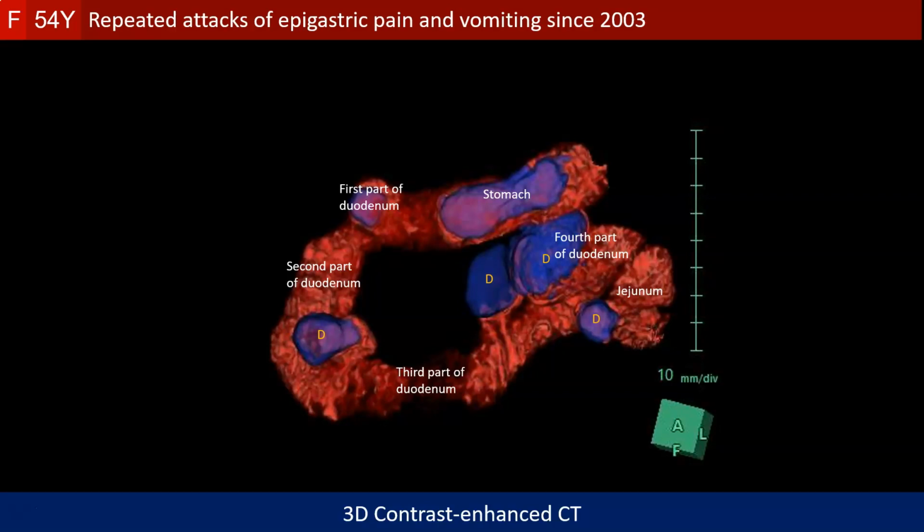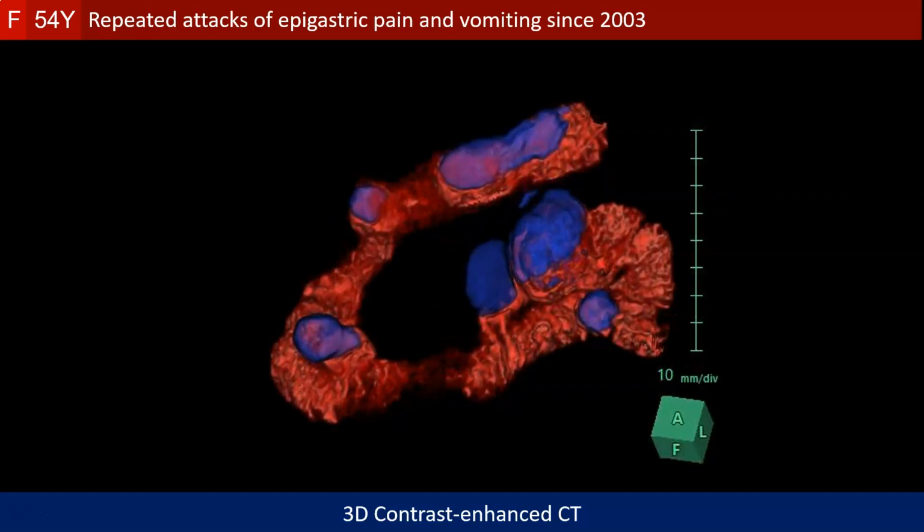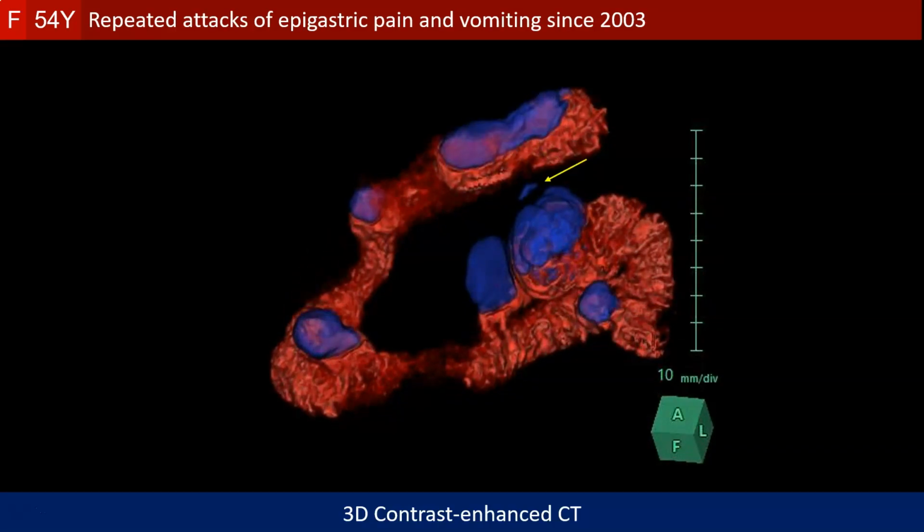Then we come to the second part of the duodenum, and between the second and third part of the duodenum we see the para-ampullary diverticulum, and at the fourth part we see 2 diverticula, and at the jejunum we see 1 more diverticulum. Rotating the frame, we can appreciate here the extraluminal gas bubble, which denotes perforation of one of the diverticula, probably the one sitting at the duodenojejunal junction.